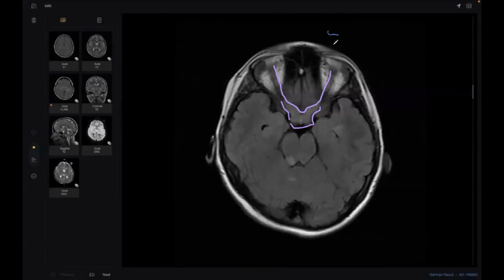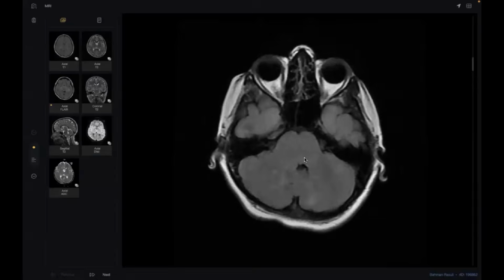Sir, it's a demyelinating disorder that is also involving the optic nerve. Demyelinating? What else? Let's wrap up what you find.